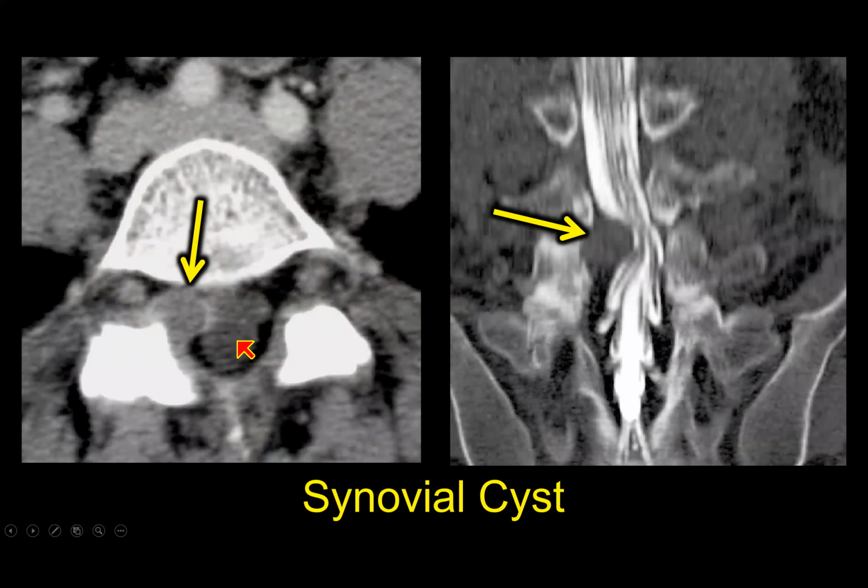If we're doing a CT, here's an axial CT standard algorithm, and here's a myelographic image correlating case where you see that synovial cyst. This machine is just a big, stupid densometer, so we're looking at densities of stuff. This is fluid density. Remember, we can always measure that density at that level. And if we have a facet fluid collection, that's a good appearance for synovial cyst. We see them coming off right here.